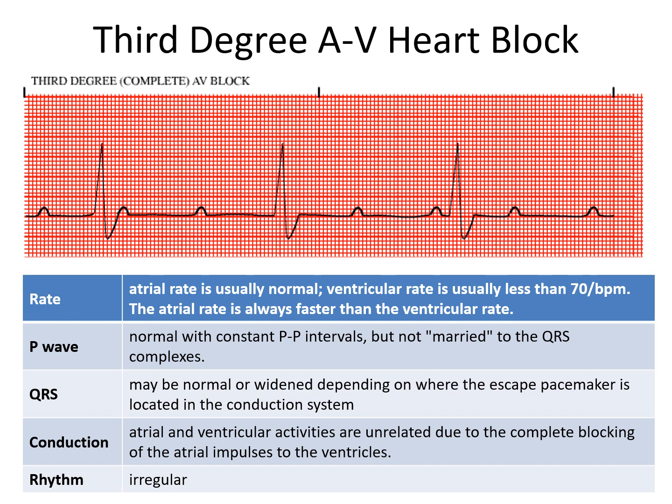I like to give a little story because let's look at this, the way that these P waves and ventricular contractions go here. P, QRS, looks like there's a P, P, QRS, P, P, QRS, P, P. So what's going on here is that the atria and the ventricles are completely disassociated. Okay, so I like to give that story of a divorced couple living in the same house. For whatever reasons, they've had to stay in the same house, but they're legally divorced, and they're each doing their own thing.